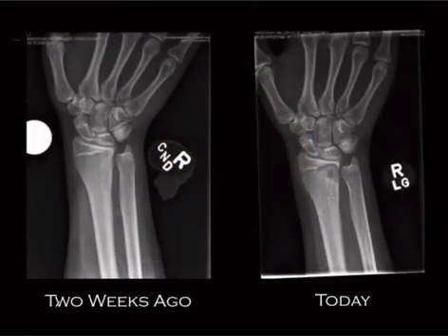Great case. So 2 weeks ago and then today, notice that we've developed a lesion right here in the metaphysis, and it occurred over a 2-week time period. So there's nothing else that can do this. The only thing that can do this is infection, right? So it's a very short, aggressive process. Was recently normal, now it's not.